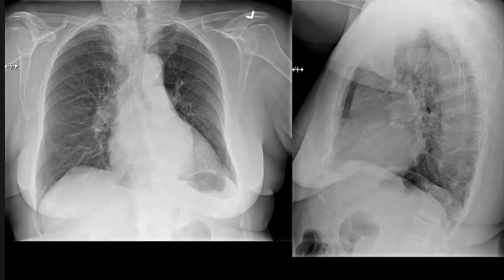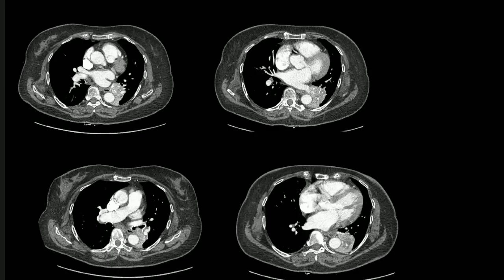Whenever you say that you want to look at the previous radiographs, the examiner knows what you're looking for, and he has a set amount of points for this line, even though it's quite possible that he doesn't have previous imaging. For example, in this patient, I do not have any previous imaging. So what do you think now?